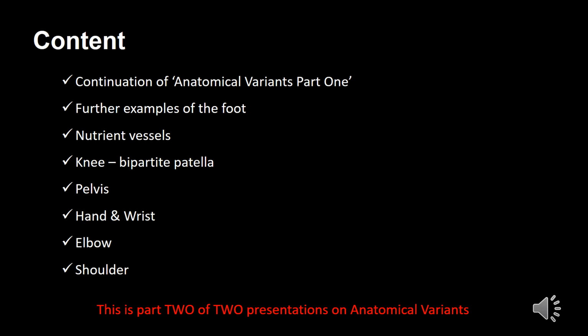Welcome to Anatomical Variants Part 2. This is a continuation of the Anatomical Variants Part 1 presentation. We did look at a lot of examples of the foot in Part 1, but we need to look at some more in Part 2, so we'll start with that.